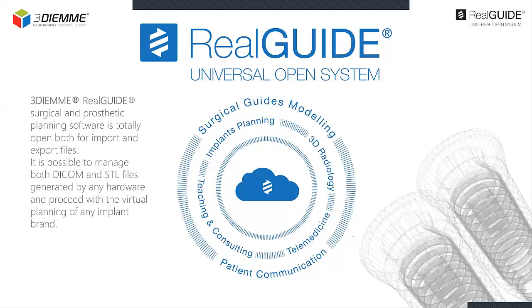Once the necessary data is imported, the software will be able to match the files to get all the information we need to proceed with the implant planning. Real Guide is a Class IIa medical device, and it's CE marked and FDA approved.